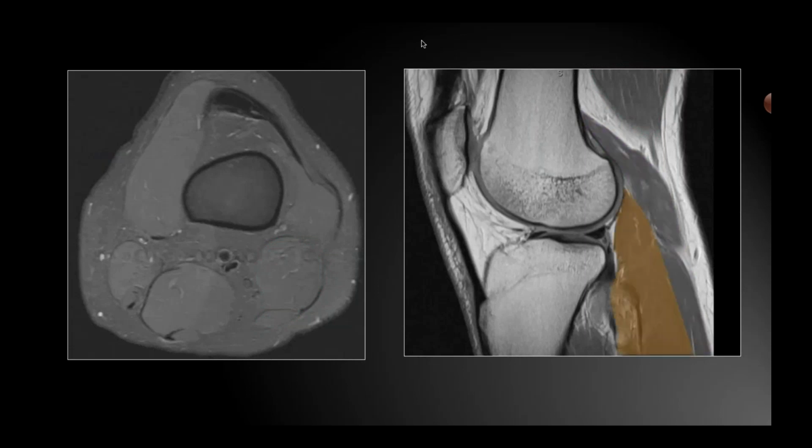Okay, I think there's a couple more. All right, and then just in general, last one here. This is not a muscle or a tendon, but that's okay.